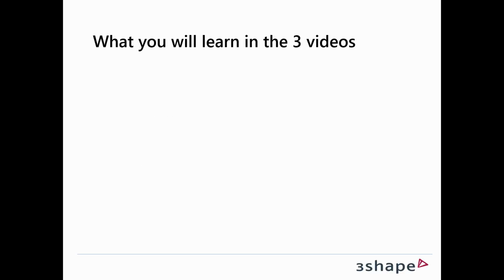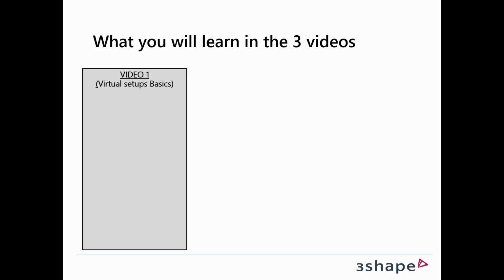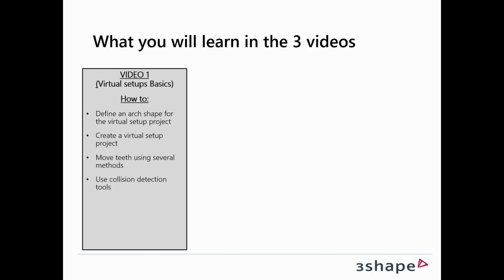So what you'll learn in the 3 videos. The first video, which is this video, will tell you how to define an arch shape for the virtual setup project, how to create a virtual setup project, how to move teeth using several methods, how to use a collision detection tool, how to export a virtual setup model set for treatment monitoring, and finally how to export a video animation.